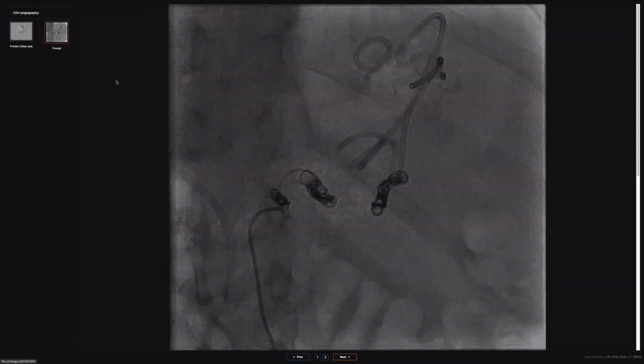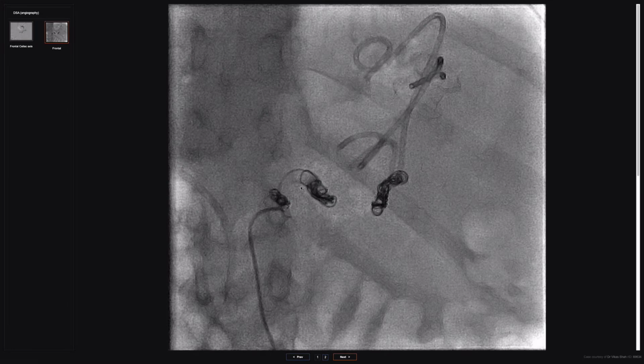And then they have successfully embolized proximal and distal to exclude that pseudoaneurysm. Now, when you're protocoling studies for pancreatitis, if it's the first one, then a standard portal venous phase study will do. But for the subsequent follow-up studies from 4 weeks onwards, the patient needs to have a dual phase study.